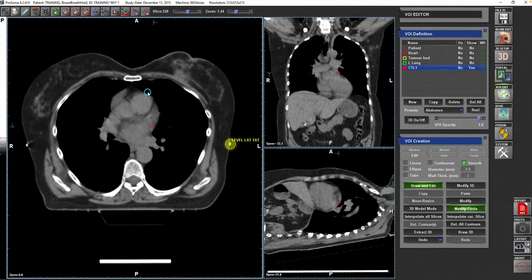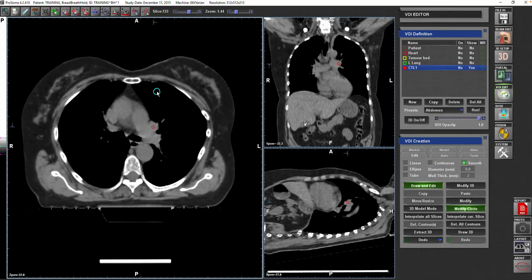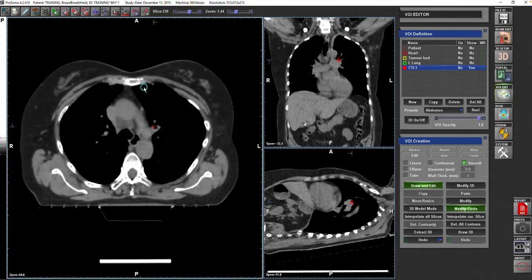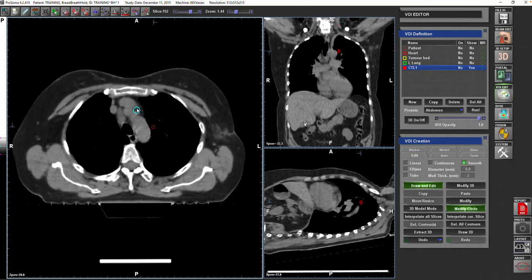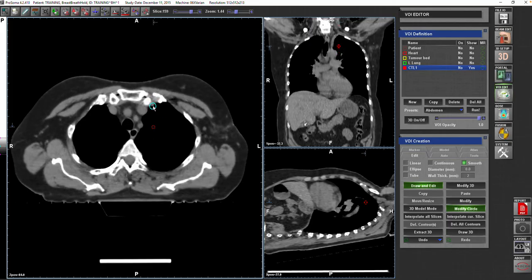And if we know that the veins usually are ventral and caudal to the artery, then these vessels will not follow each other when you go up. When you go up very close to the origin of the vessels, you'll see that the vein will start to disappear whenever the innominate comes into place. So the vein will end in the innominate, while the artery will go to its origin.